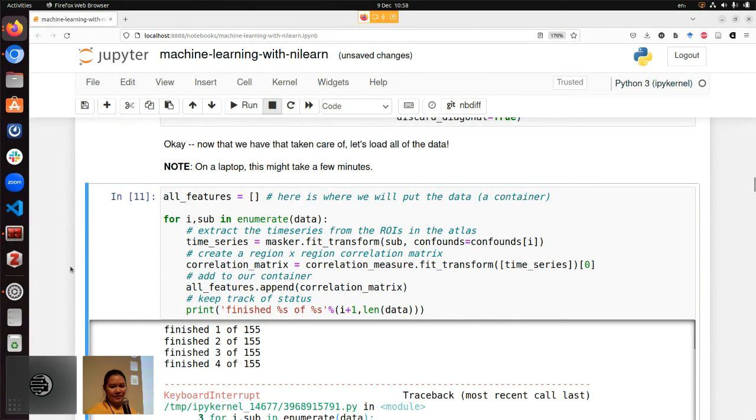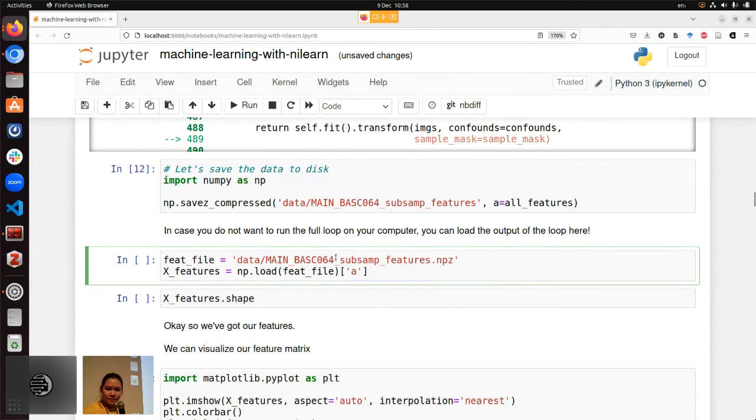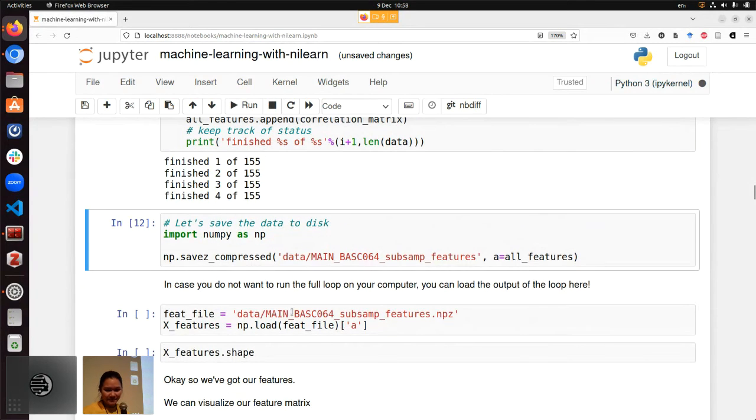Oh my god. So I can load it over here, and people can keep running that cell. Oh, I just realized I did something wrong. I need to run this. Sorry. Oh god. It's going to be fine.